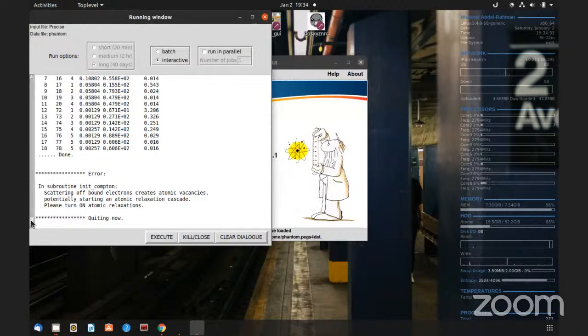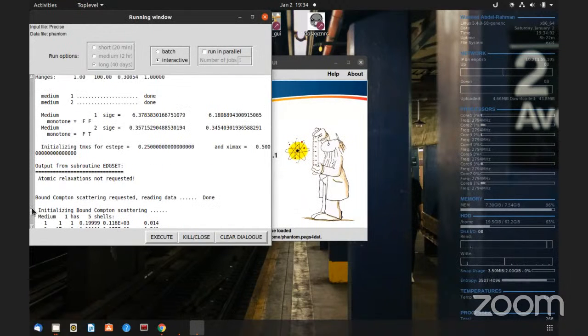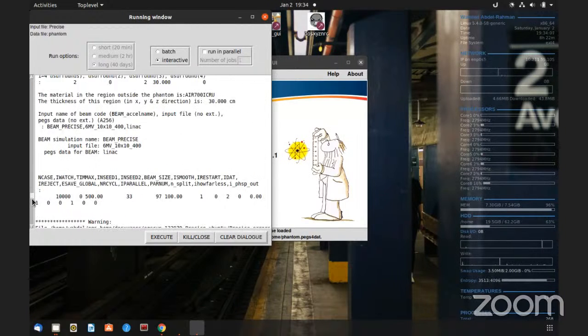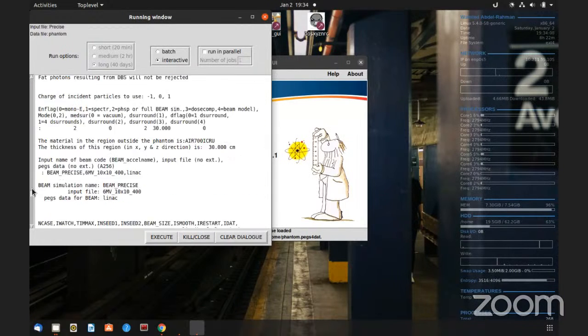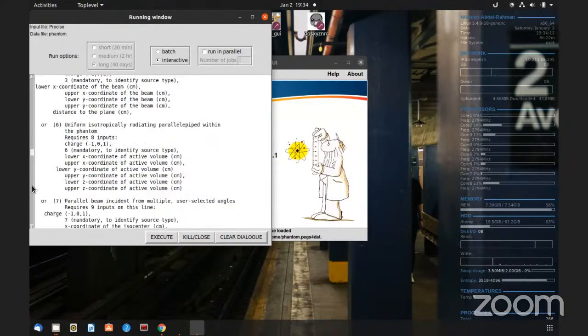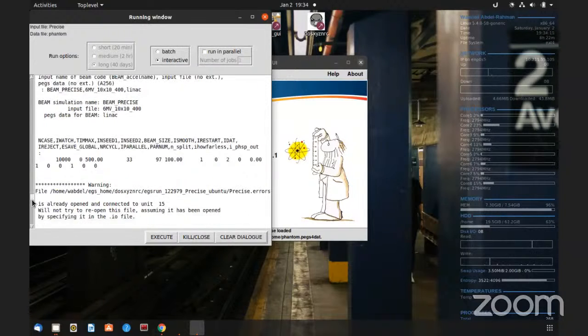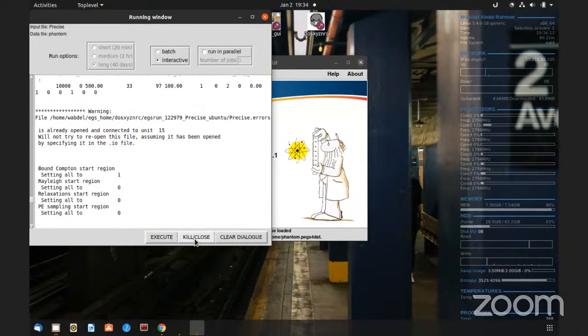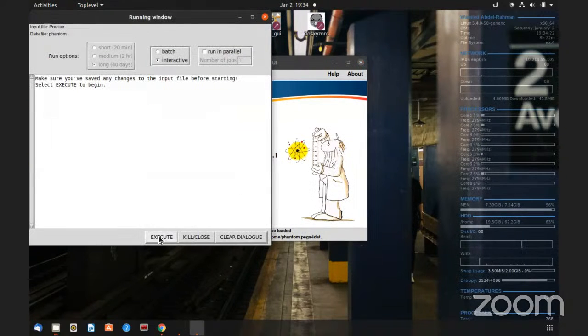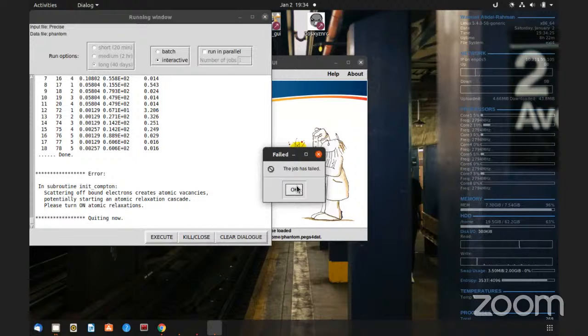Job has failed again. Okay, let's go and check what's going on. Where is the error? Okay.